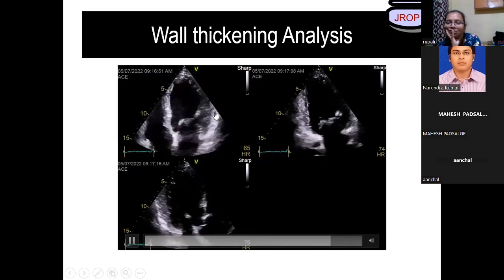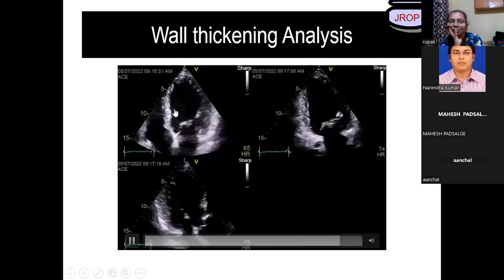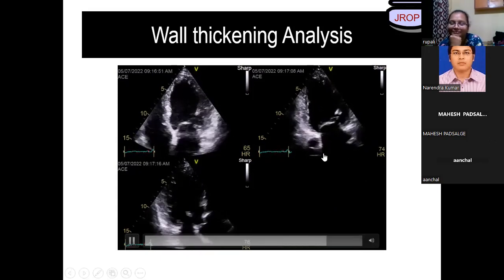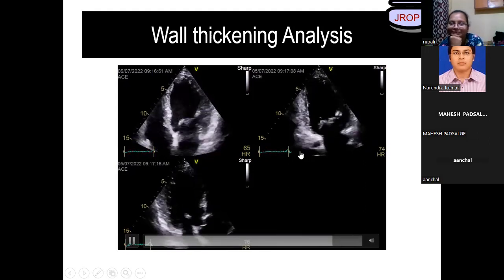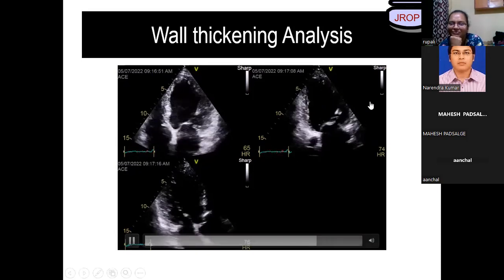God has not made till date any papillary muscle attached to anterior septum or septum. Is yet in the process to create another few papillary muscles. Got it, everybody? So your first answer should be, sir, this view is wrong. The day we understand why we are talking of wall motion abnormalities, itself they'll tell you, look, this is not correct.